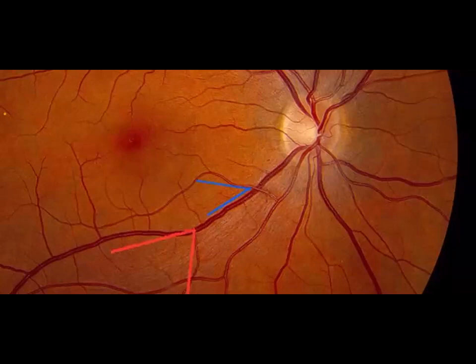Is this clear, doctor? The normal shape of the optic disc. Yes, doctor. Medially or nasally, it will be blurry, not sharp, not well demarcated, not like the lateral side. The lateral side will be more glary, more shiny, more well demarcated. This is the normal shape of the optic disc. And then you will find all the vessels gathering together here, as if they have a meeting here, in the center of the optic disc. This is the area where all the retinal vessels, retinal artery, retinal veins, and so on, will enter the optic nerve. So this is the normal shape of the optic disc.